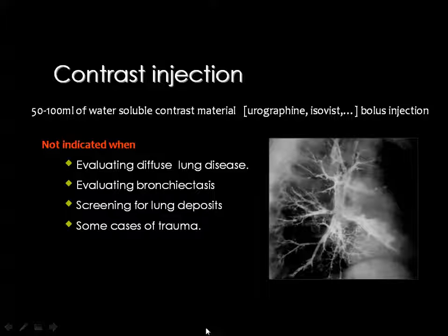Then, is every patient in need to be injected with contrast material? No. Actually, we inject contrast media to identify or to augment the appearance of the vessels in the mediastinum. Most of the mediastinal structures are vascular.